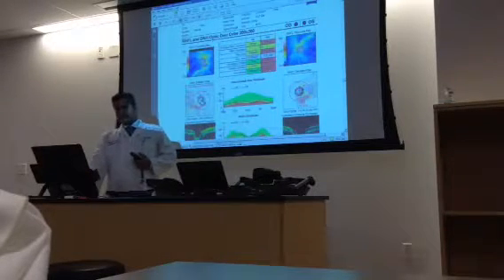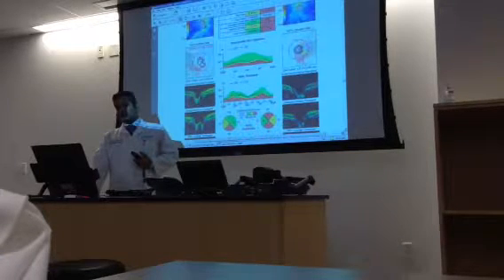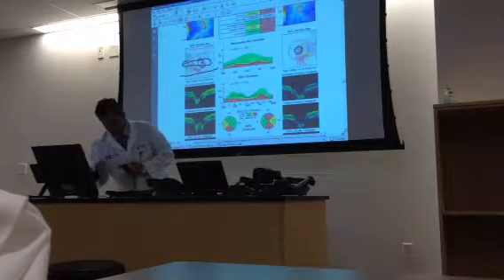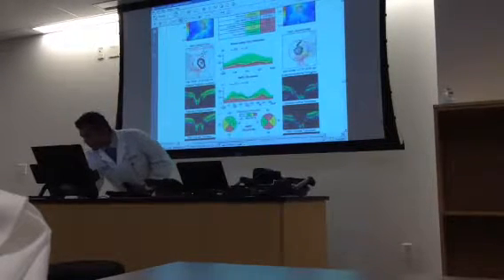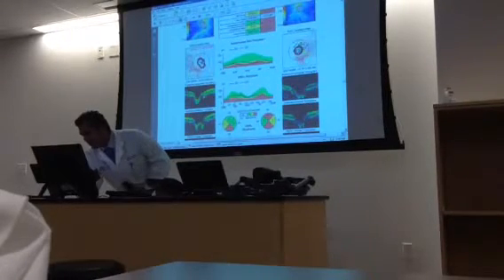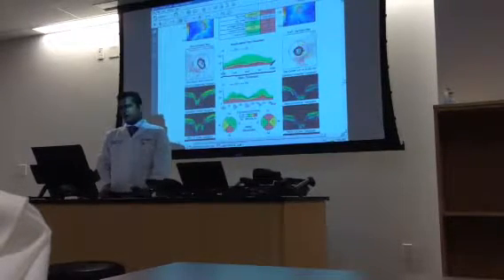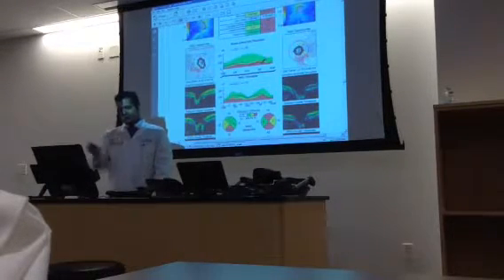So you have all these parameters that are very self-explanatory. You have neuroretinal rim thickness, essentially is this thickness right there. Let me shade that area. Take this shaded area, and plot in XY axis, you get this plot right here, your retinal rim thickness. Again, showing you that if it falls in the green, that's good. Falls in the red, it's not very good.